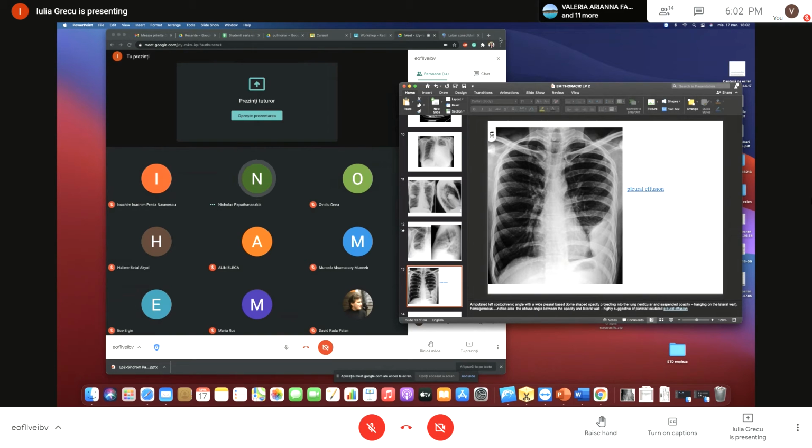That's a good question. I thought you already had the answer. Maybe we'll have them lie on the affected side, and then, well, they're standing in this picture, right? They're standing.